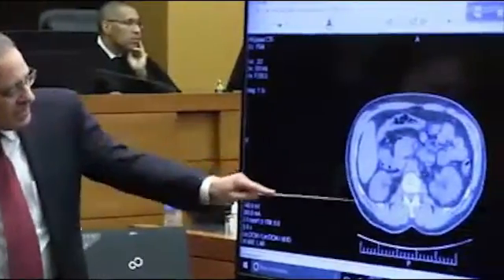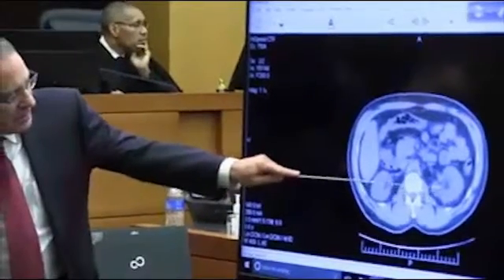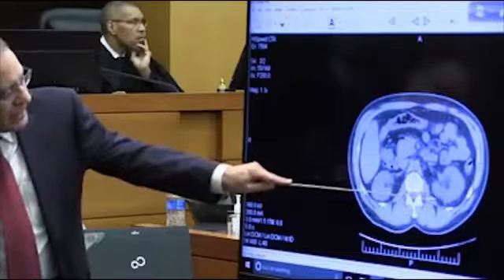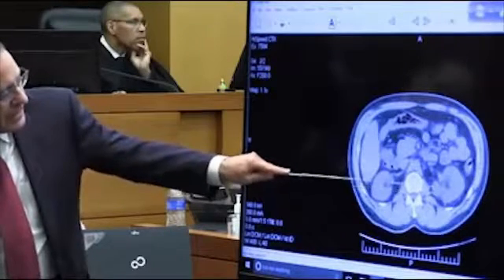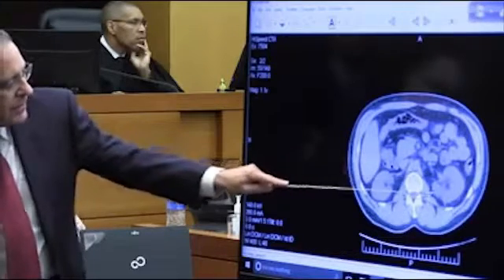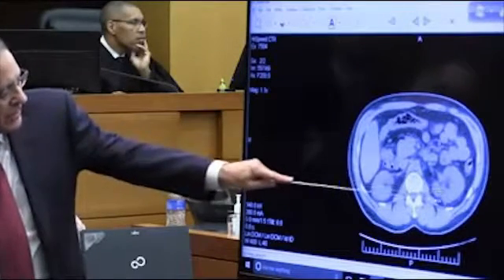If we look at the bottom of the left kidney, what's going on there? Well, this is interesting because when I see this image, I notice this lump, this indentation here, this dark linear line. I don't think that's anything. I think it's just part of the normal kidney, although it may have the appearance of something sort of coming off of a nodule, but it's really not.